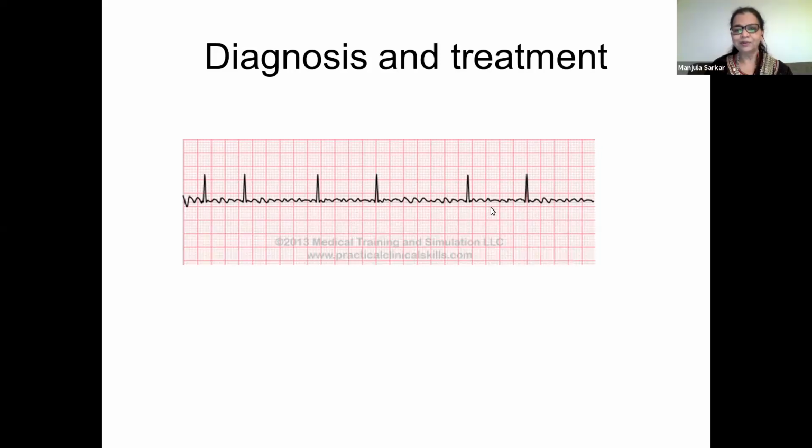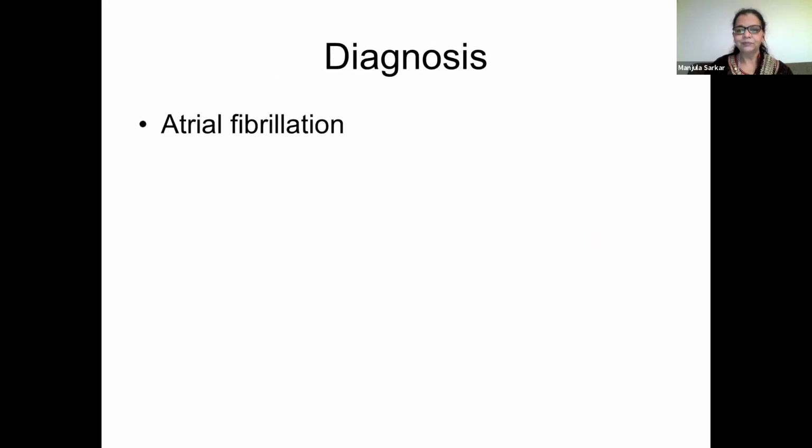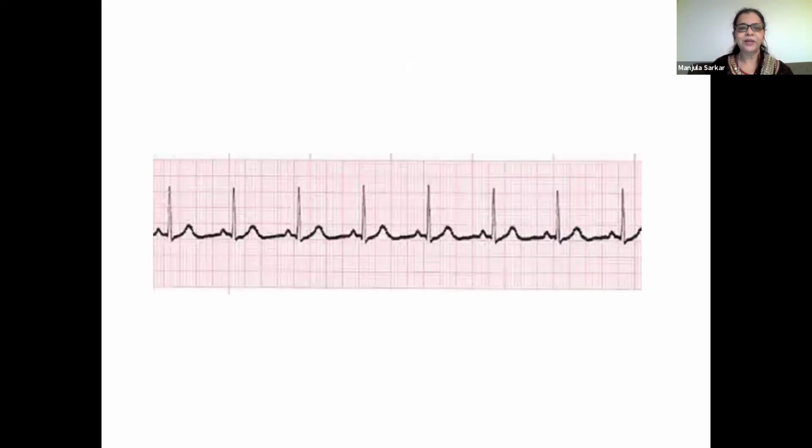Now why is this not moving? So this is atrial fibrillation. Now, can you tell me what this strip is telling you?